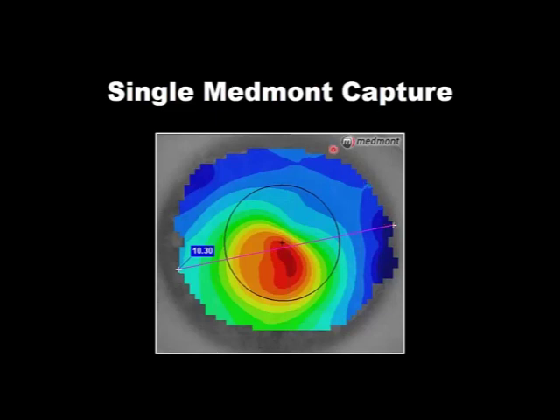However, you notice there's some cornea missing out here, some visible iris, where we have not been able to image. And that's typical of corneal topography. We don't go limbus to limbus. We typically measure with large cone topographers 8, 9, maybe even 10 millimeters. With small cone topographers, we typically image 9, 10, or 11 millimeters. But if the visible iris is 12, there's a good chance we're going to be missing some of it.